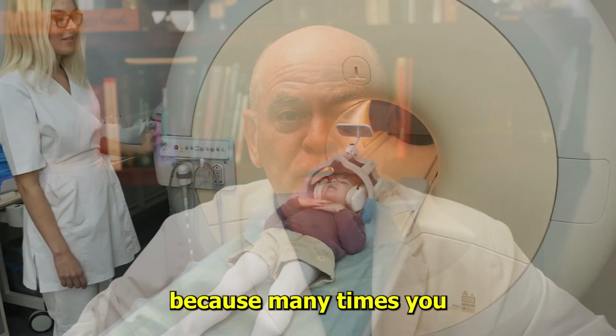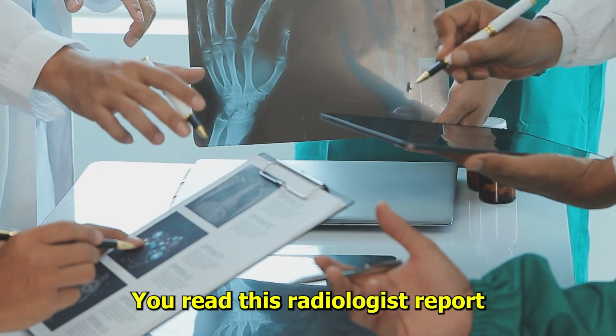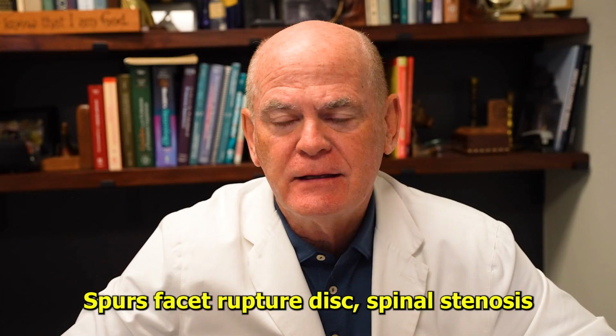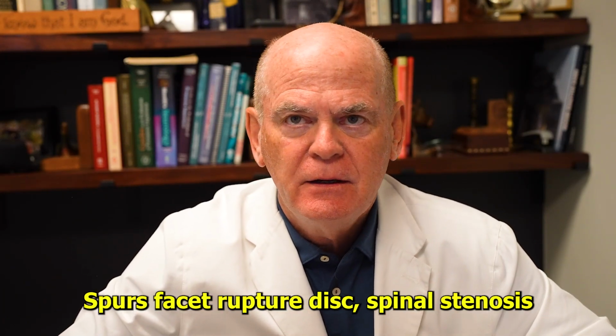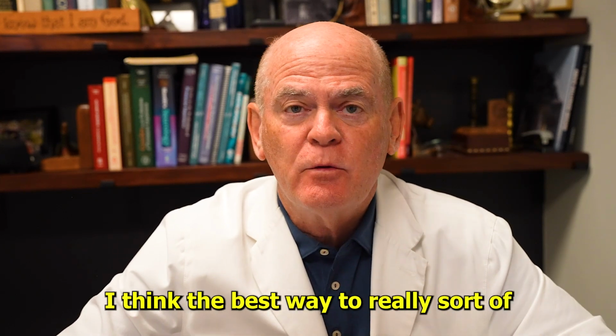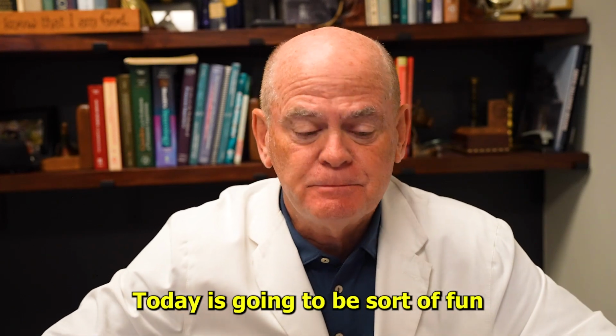Because many times you'll get an MRI of your neck and you're told, I got all this stuff. You read this radiology report and it's like 400 pages long: degenerative this, degenerative that, spurs, facets, ruptured disc, spinal stenosis. So what does all this mean? I think the best way to really know is just look at a bunch of films. So let's do that today. It's going to be sort of fun.